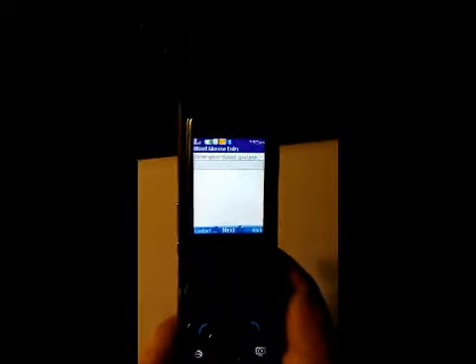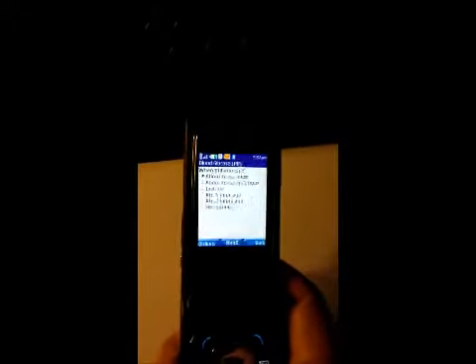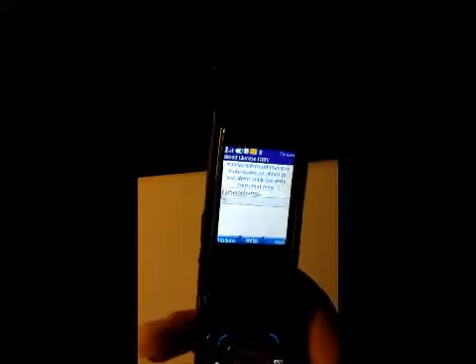Let me just show you how this works on submitting a blood glucose. It's now going to access our record, or my record. And it's going to bring up a series. It says enter your blood glucose. So I'm going to do 125. That's going to be fine. 125, and I just press next, and then it'll ask me whether I'm about ready to eat or not eat, and I'm going to go down here and say that I'm not going to eat. Oops, I mispressed that, so it's going to eat. I'm going to put 35 grams of carbohydrate as my meal. It's an awful lot, but okay, next.